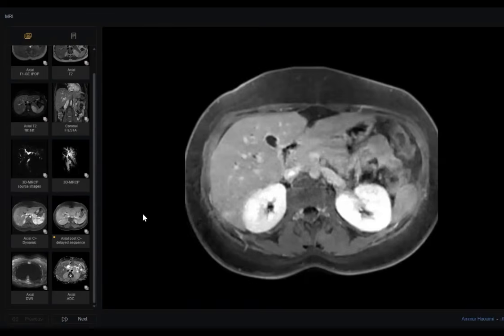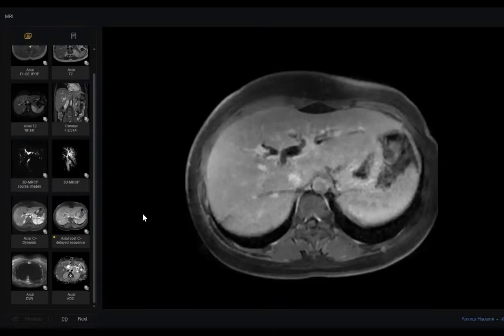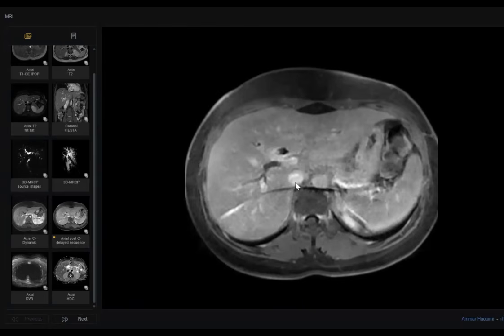So at this region, so here. This one? So in the lower section, I just noticed there was some indentation. So what's your final diagnosis?